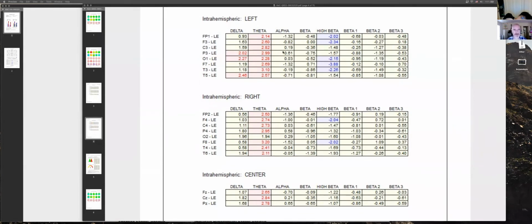A wide spread suggests the speed we're seeing is actually you when inhibited. It should be faster and is broadly faster, except you're not able to bring the speeds up enough. And the places that are slow are probably a function of your apnea, or lack of deep sleep. So you're basically the sports car running with the emergency brake on. The emergency brake is the deep sleep.